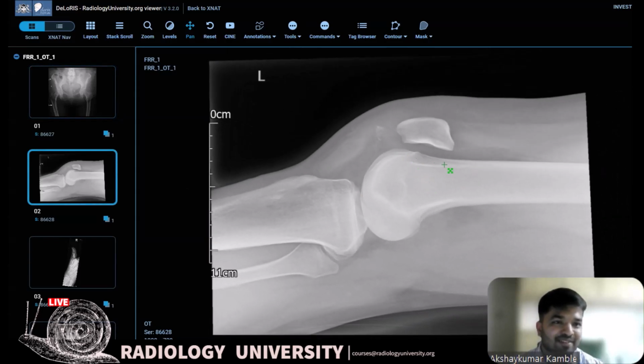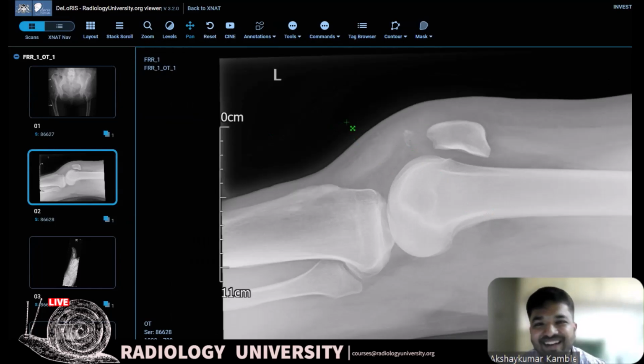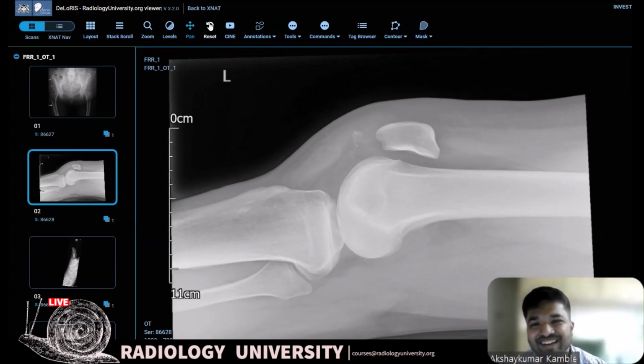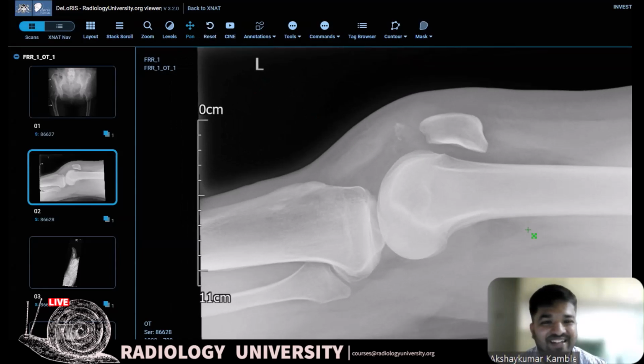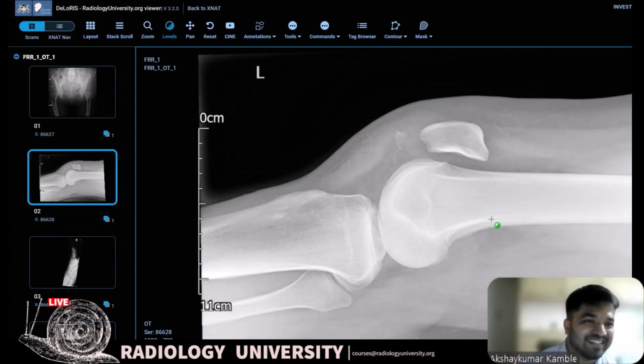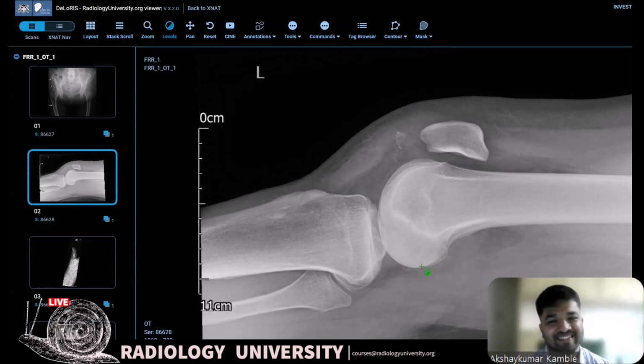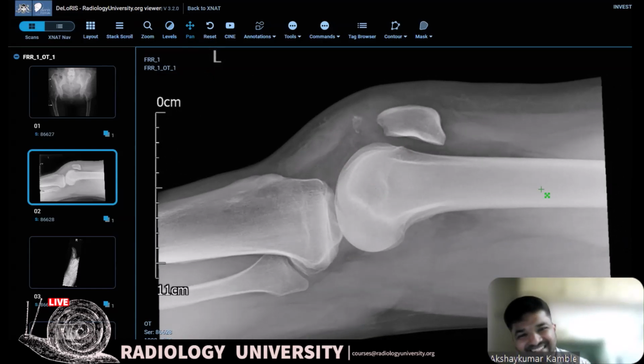I think if Dr. Weisley is here, he should take this case because he made me read something. I needed to go online to find the differential he wrote. So do you want to take it, Weisley? Yeah, wait a second, can you hear me? Yeah, I can hear you. I've searched back my diagnosis. It's not the same as this one. Yes, but for the benefit of others, can you tell what did you think and why it is not that?